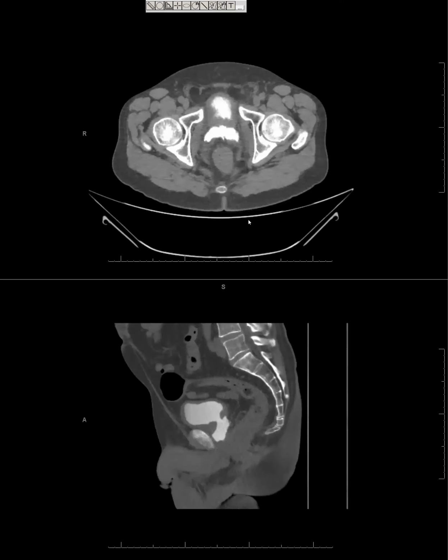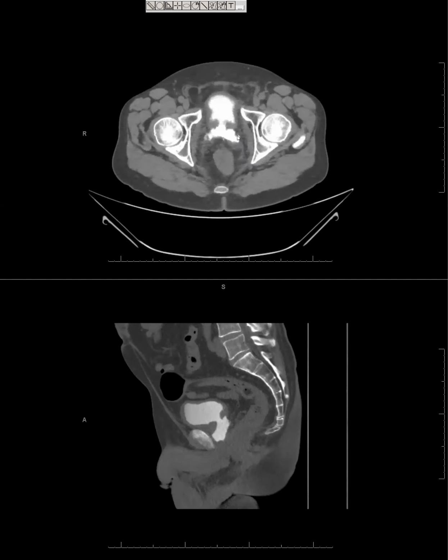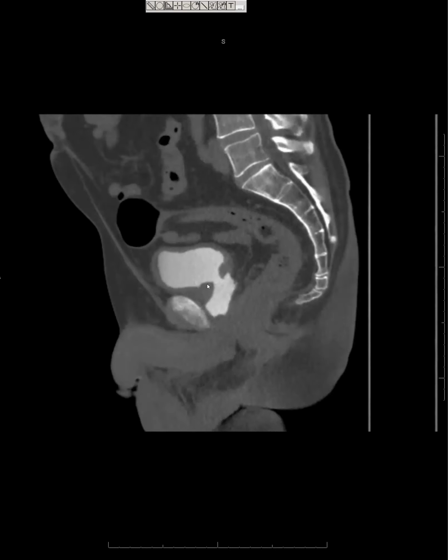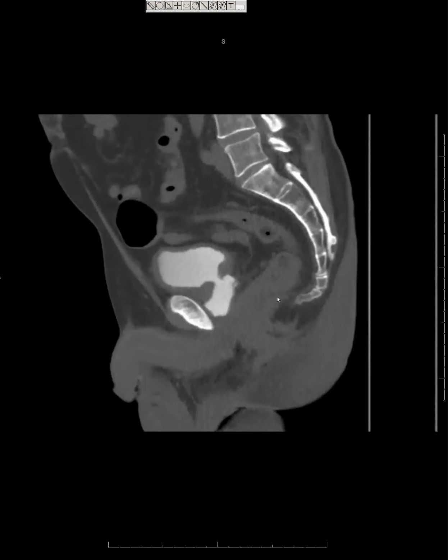Subsequent to this, I think the same day, a CT cystogram, which is this. On the axials, you can see the bladder here, and then usually you suspect it to be anastomosed to the urethra approximately here, but then there's this cavity of contrast in between. Almost feels like where the seminal vesicles used to live. And on the sagittal recon, you'd expect this bladder neck to be anastomosed down here to the urethra, and now instead we have this contained leak cavity in between. It's so nicely contained, I wonder if it almost doesn't need to be fixed.